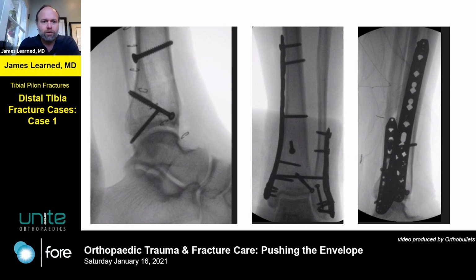When I went through the details of it, this surgeon chose a medial plate, which for me is an anxiety-provoking implant because of how stiff they need to be and how little soft tissue there is there. Because of that, you know that the incision, or at least a dissection, has to be medially based. And that raises a whole other set of questions and often another set of eyebrows.